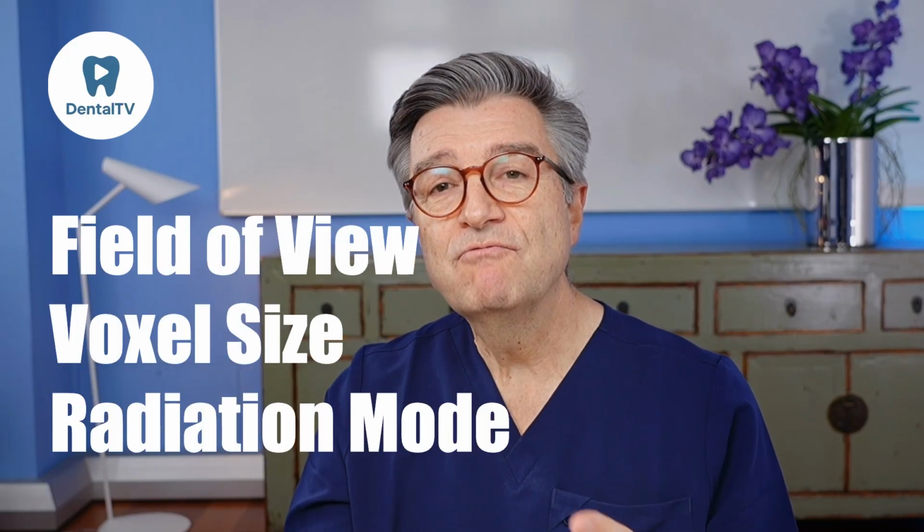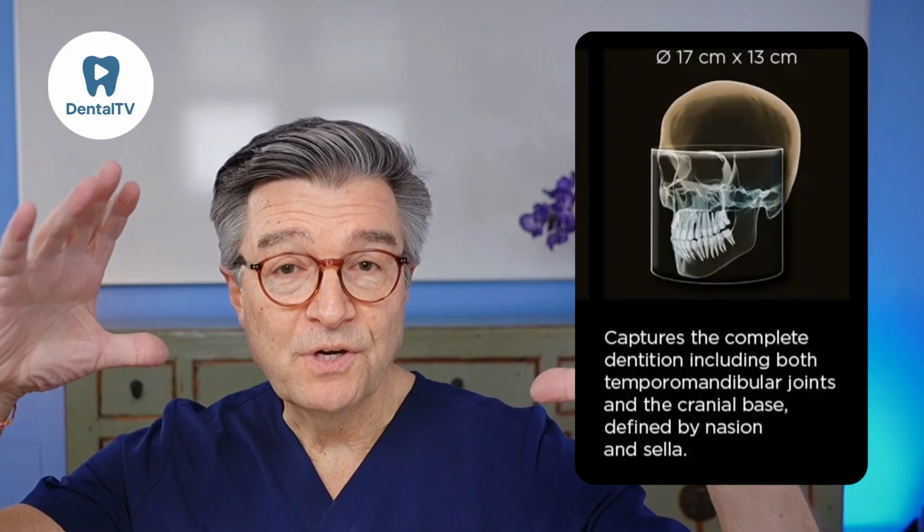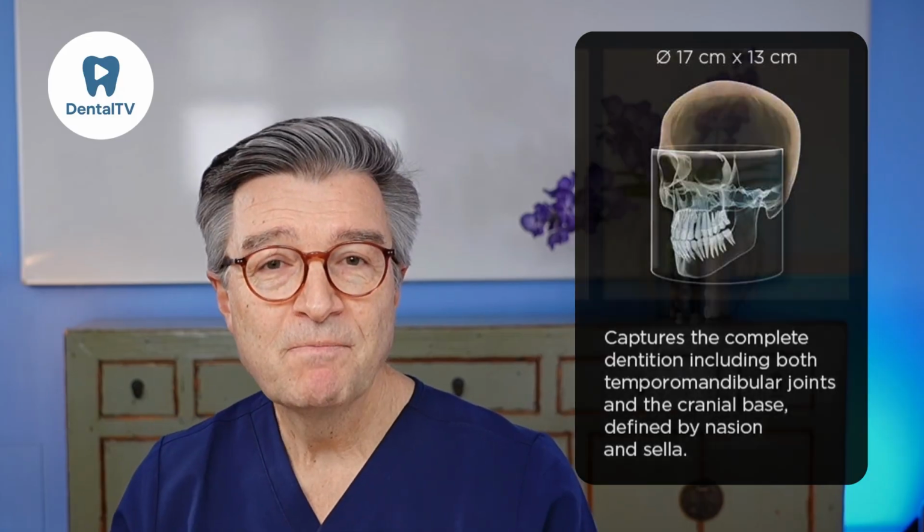There are three additional factors that define what you can and cannot diagnose: the field of view, the voxel size, and the radiation mode. A small field of view provides excellent detail for endodontic or periapical evaluation, but does not show the surrounding anatomical context. A large field of view gives you orientation and overview, but the image becomes less detailed. Before interpreting a case, you must always know whether you are looking at a small or large field of view.